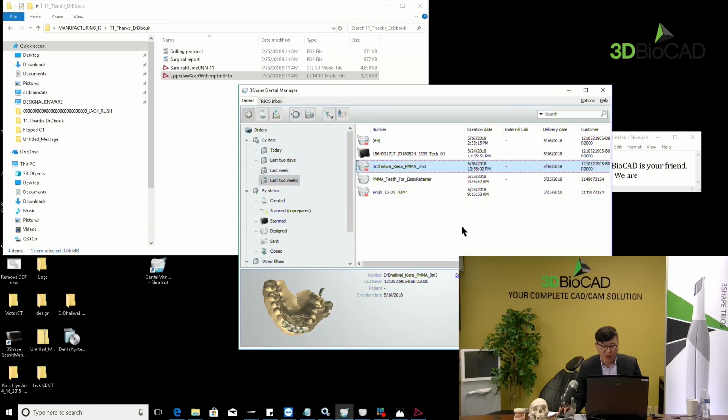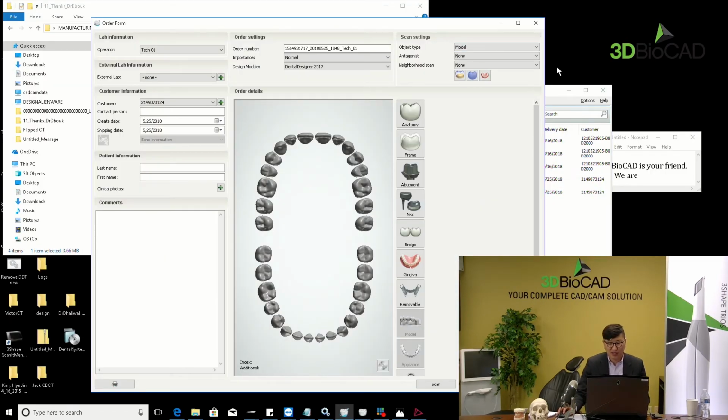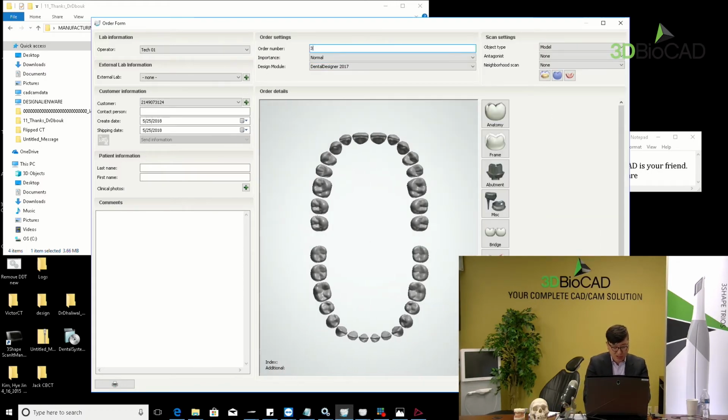Let me just create one work order here. Okay, so we want, let me say, 3D Bio. It was tooth number 11, and in the FDI number system, 23. Just click it. Now we have to think, or discuss with our doctor, which way the doctor wants to go.